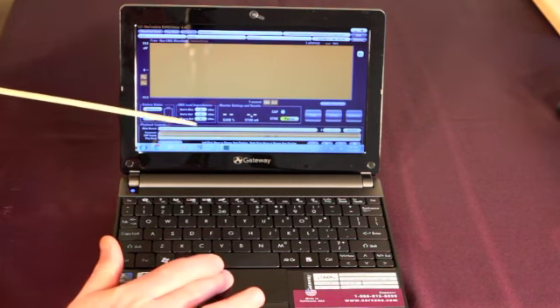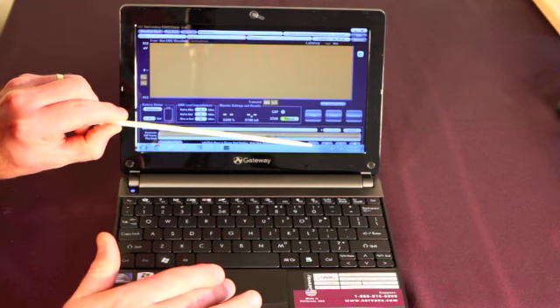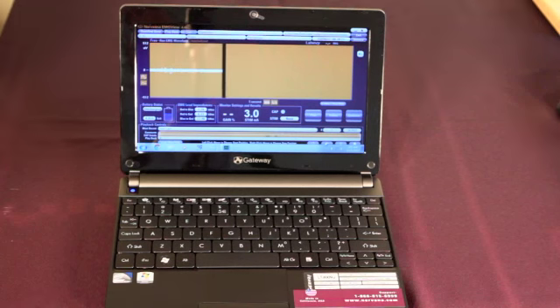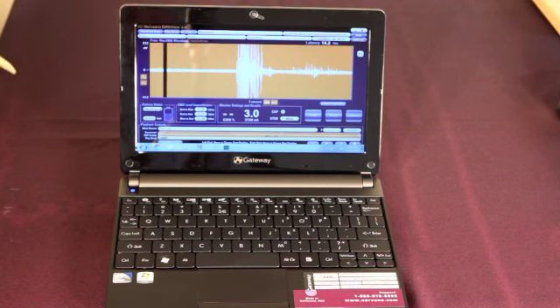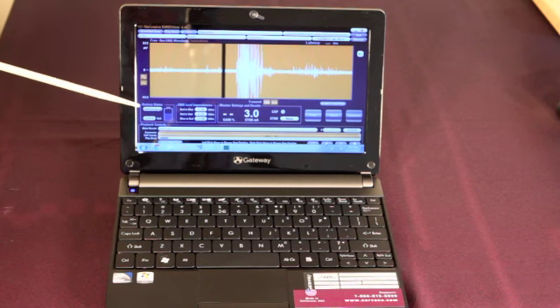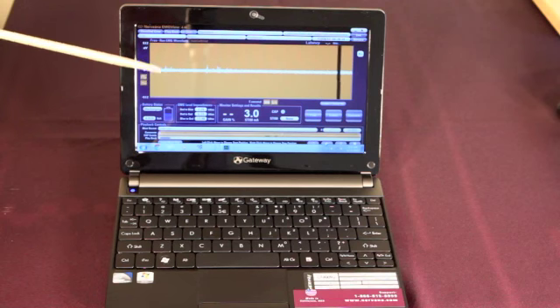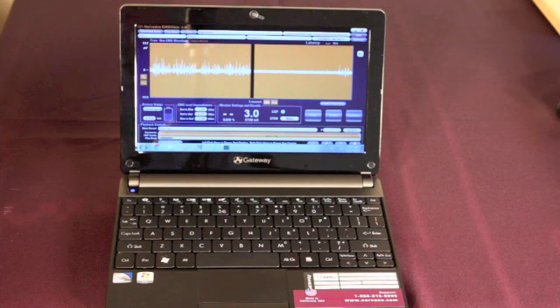I'm going to go ahead and move over to this control that's a play button, and I'm going to press play. And now what you see here is the surgery beginning to be played back, or the recording played back over the PC. And what you'll note here is that the battery setting, the impedance measurements, as well as the settings for the gain and the stimulation will all be recorded here.